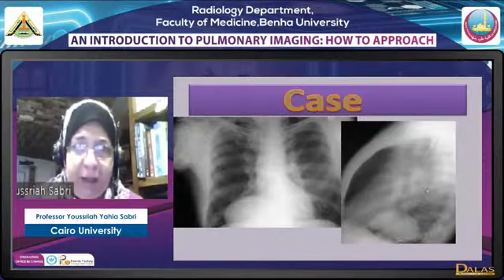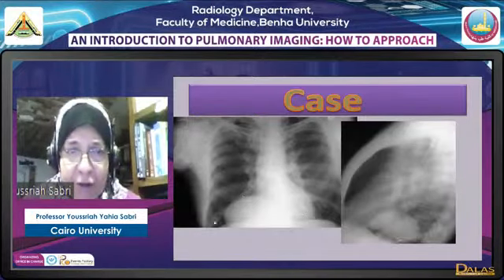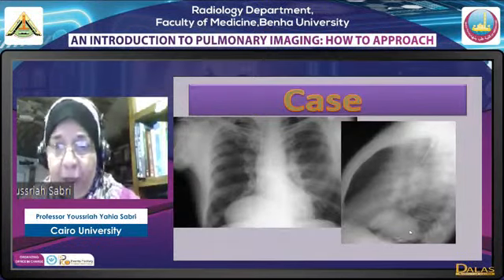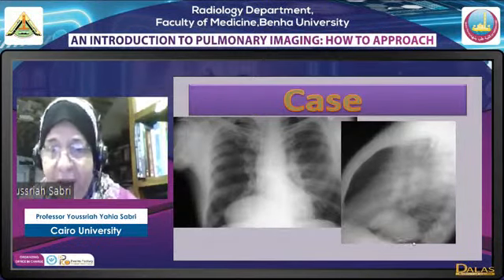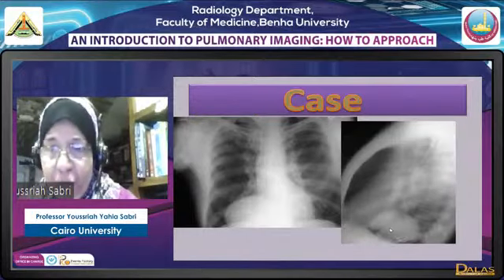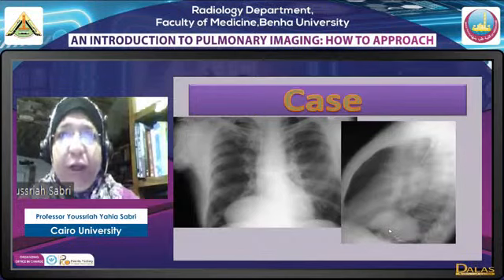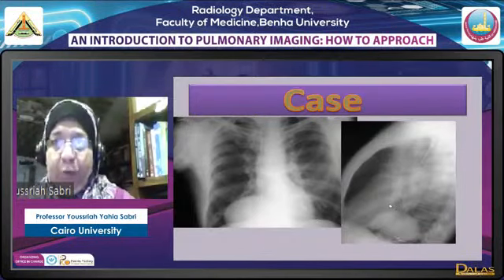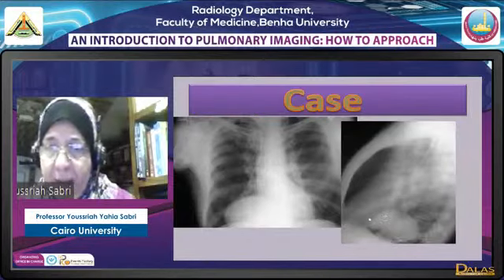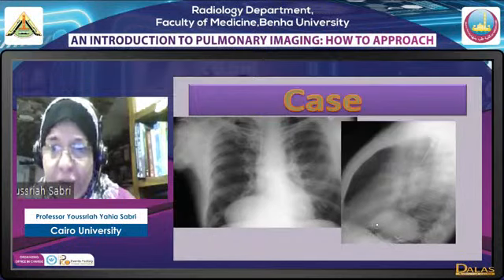هنا plain X-ray PA and lateral. We have a very large mass lesion. هفكر هنا في bronchogenic carcinoma؟ لا. المورفولوجي هنا عندي a very smooth outline. رغم ان الليجن very large we have a very smooth outline. طب هو البرونكوجينيك ما ينفعش تبقى smooth outline؟ يعني ممكن وهي لسه single pulmonary nodule وهي لسه صغيره تبقى smooth outline، لكن it can never reach such a size keeping very smooth very benign looking lesion.